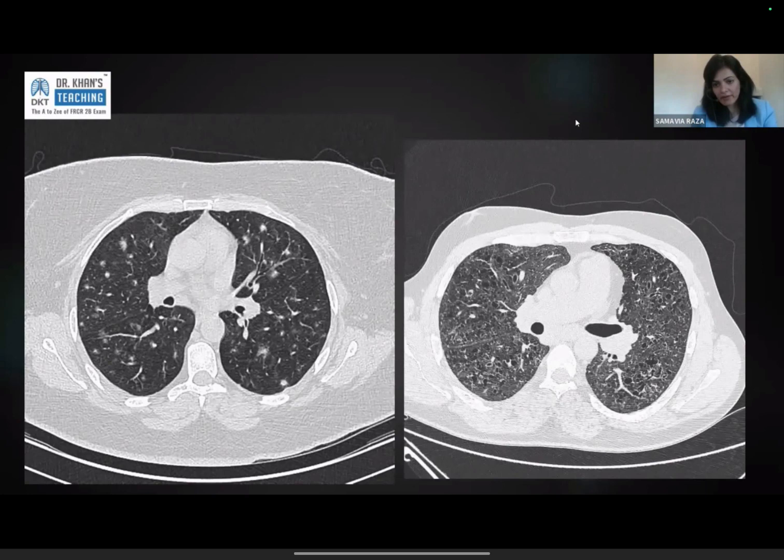It is very, very rare. It looks bronchocentric, nodular, basal predominant. It looks like atypical infection. So these patients keep getting worked up for mycobacterial infection. The airway is inflamed, and that is actually an ILD, and that is GLILD.